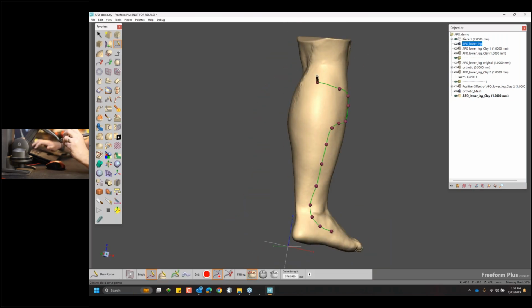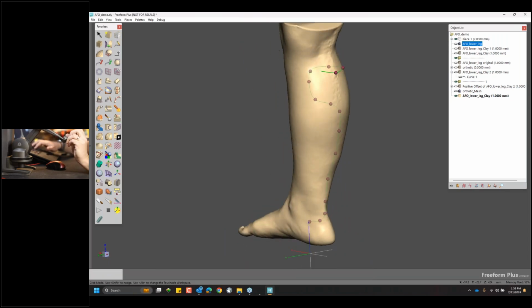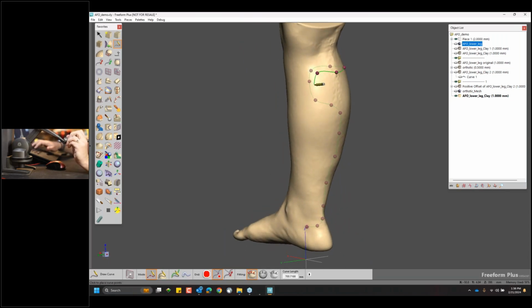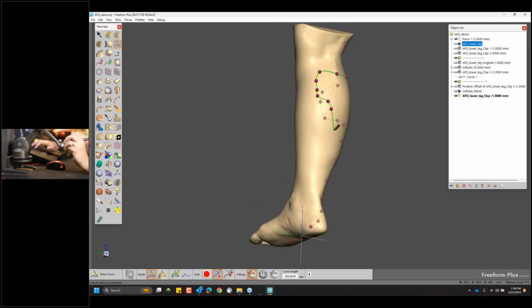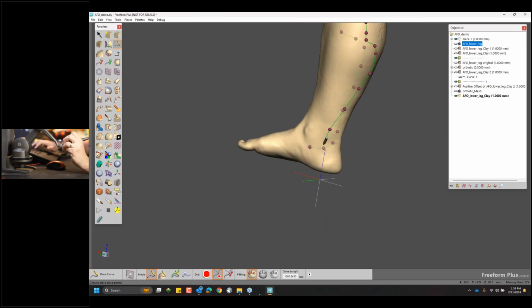And using my stylus as well to rotate my view, I don't have to worry about special hotkeys. I don't have to worry about not being able to see exactly what I'm looking at. It's very intuitive and natural to rotate, continue working from a specific view.